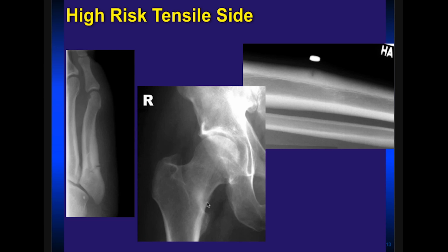This shows a stress fracture of the inferior aspect, which is the compression side, the good side, or the less risky side. And this is the dreaded anterior tibial stress fracture, dreaded black line, common in basketball athletes, a very thick cortex. So these two are treated with intramedullary screw or rod. Don't do anything to the fracture, they'll heal. In this situation, if this fracture was started up here superiorly, it is at risk to displace, and early intervention with fixing this operatively should be done if it's on that tensile side.